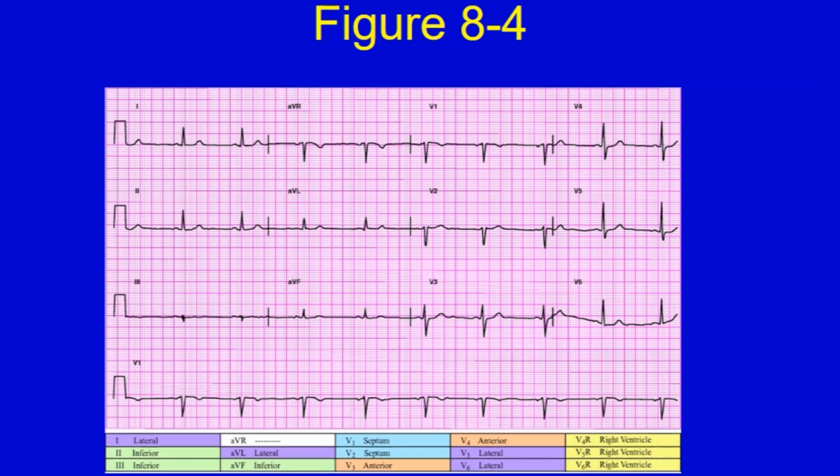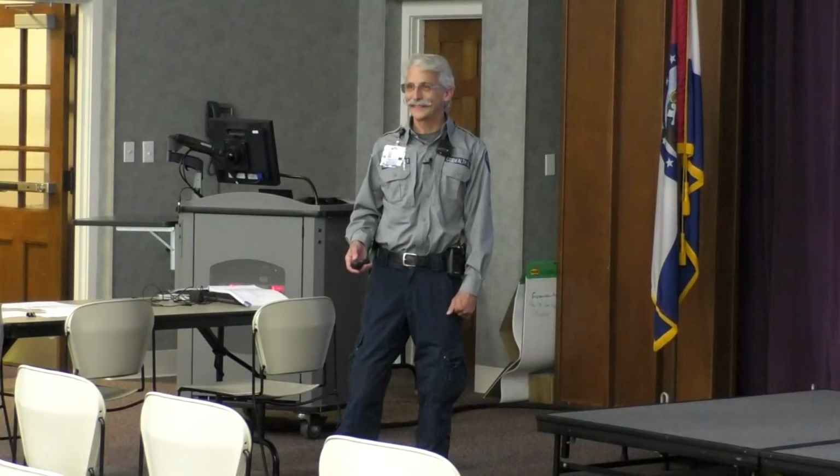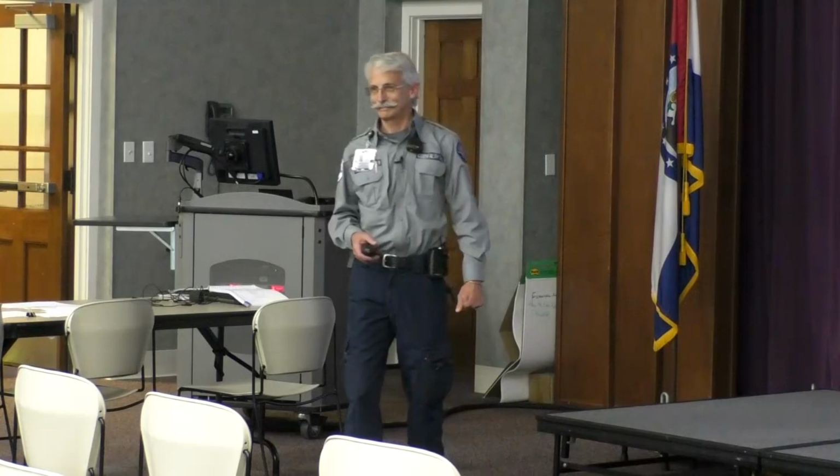So can you imagine if we put a PVC out here someplace that I wouldn't know, God, what the heck is that out there in the middle of this thing? Well, that's the reason that we have this 4-channel thing. Because I got one running across the bottom that tells me what a single rhythm is all the way across. I don't care if you do V1 or 2 or exactly what you do. Do you know you can do that with our monitors? No. You can, okay? We're not doing that today. The LifePak 15 will do that.